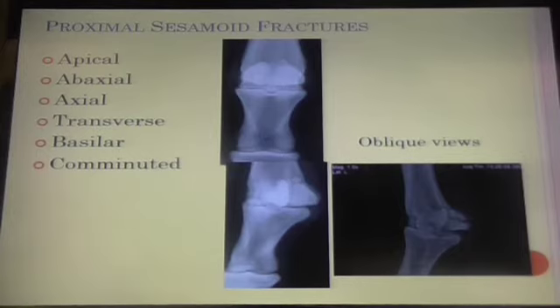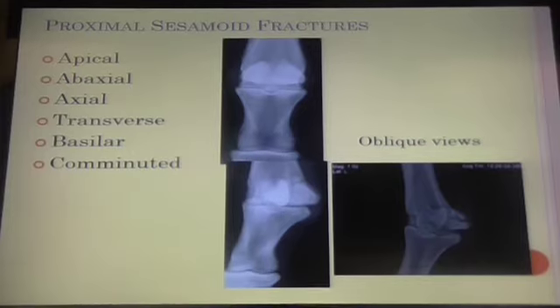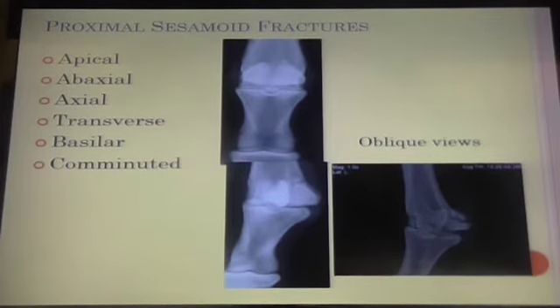No, it's a transverse right there. I'm telling you that. Okay, here we go again. I don't need you to tell me that it's transverse. I'm telling you that it's a transverse fracture. I need to know which sesamoid bone. There are two, right? A medial and a lateral. Which one is fractured? Anybody else?